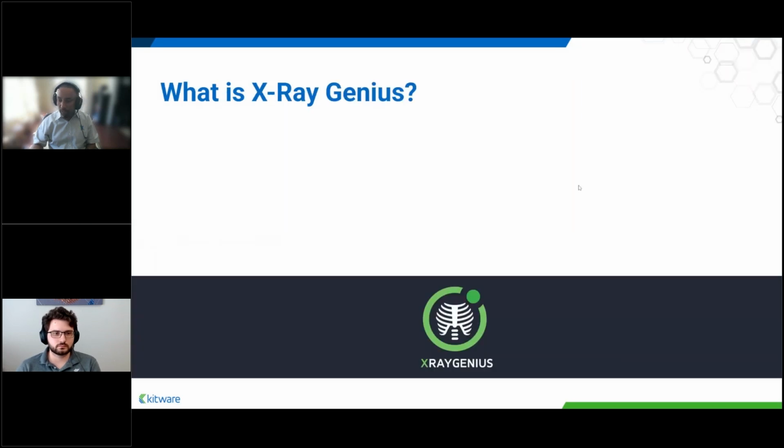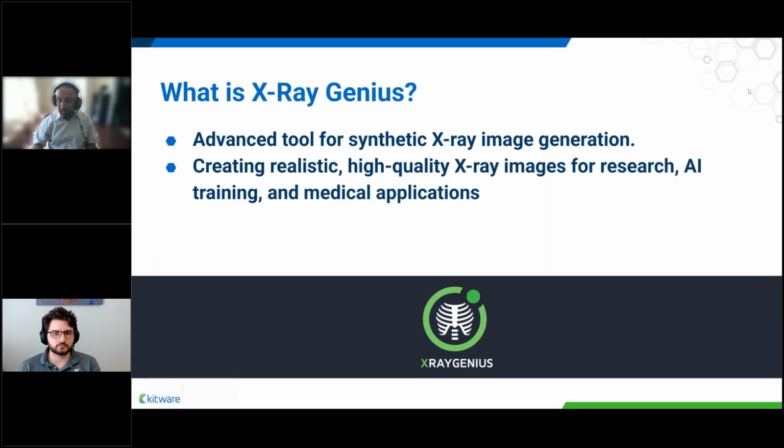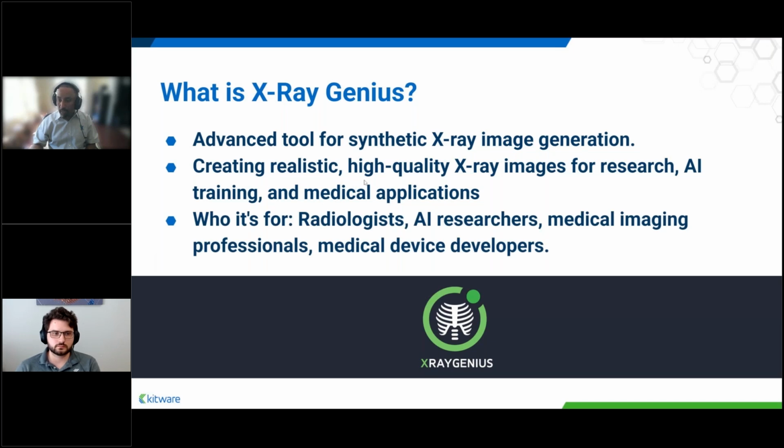So what's X-ray Genius? X-ray Genius is an advanced tool for synthetic X-ray image generation. It creates realistic and high quality X-ray images that can be used for a variety of applications, and it will enable a lot of AI development in medical imaging.